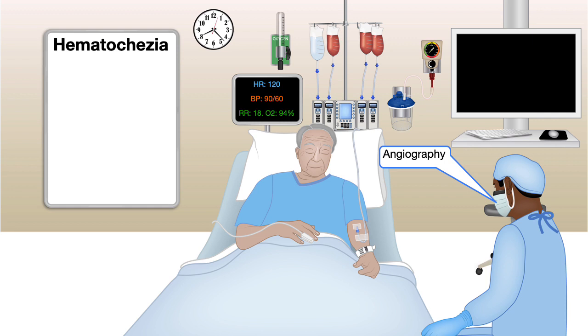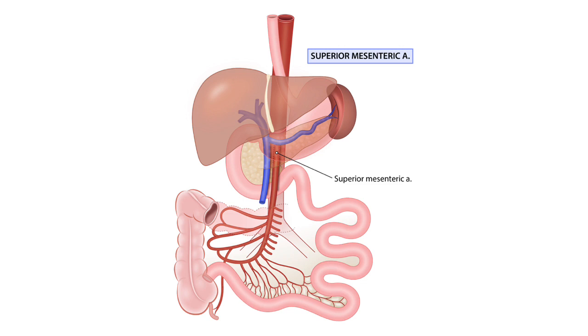And when it comes to angiography, let us review the anatomy of the colon with a special reference to the arterial supply. The right colon is supplied by the superior mesenteric artery that comes from the descending aorta. And here are the different branches that supply different sections of the right colon, starting with middle colic artery, right colic artery, ileocolic artery, and appendiceal artery.